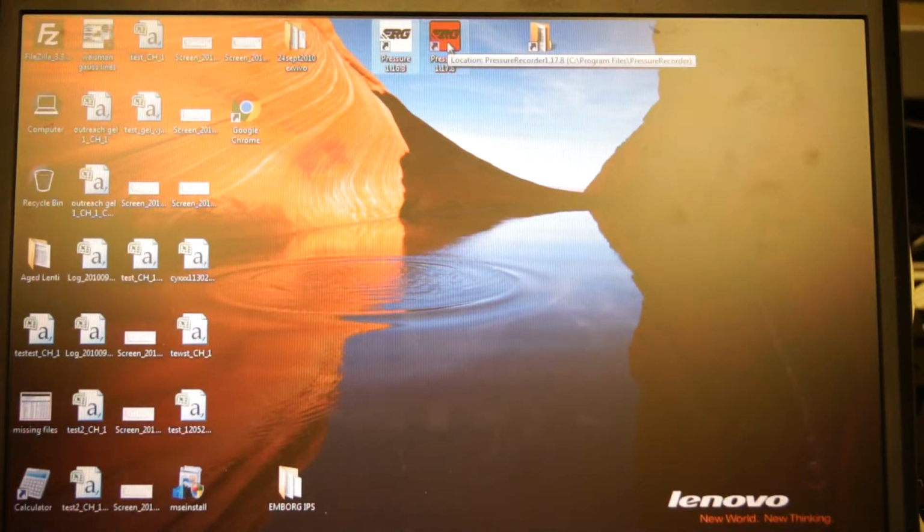Okay, the new infusion program's been installed. It has a red icon. Let's go fire it up.